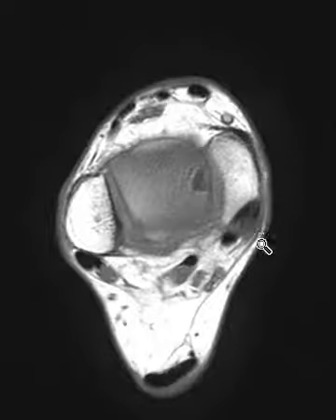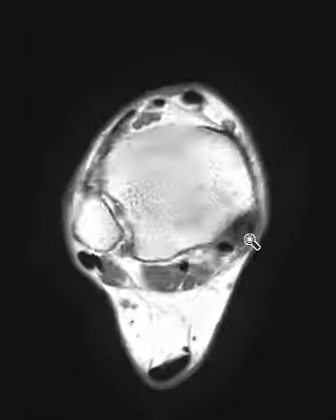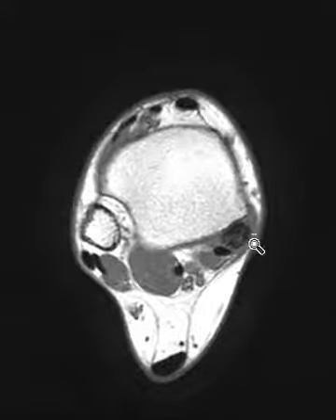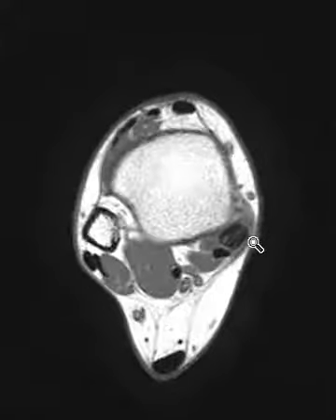And so when the tendon is just thick like that, it's not torn or ruptured, we can call it either hypertrophic tendinopathy or hypertrophic partial tear. I don't think it makes a difference. The main thing is to make sure you don't say it's ruptured or there's a gap, and also you don't say that it's attenuated, and they may want to treat this more conservatively.